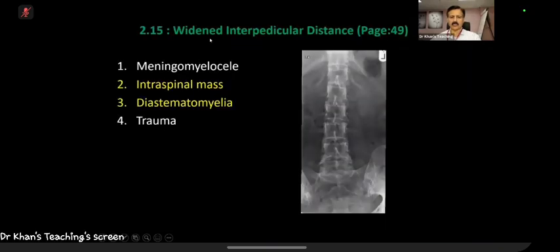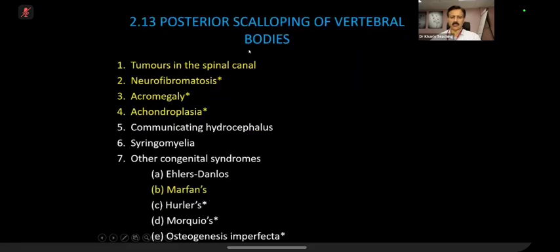And this is the differential diagnosis from Chapman: widened interpedicular distance, and there is another one, posterior scalloping of the vertebral body. This is the differential diagnosis. Tumors in the spinal canal is the most common one.